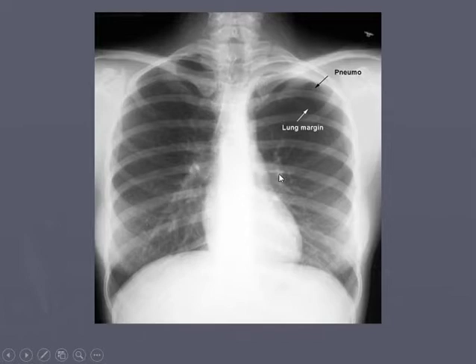Pulmonary artery here, pulmonary artery there. It's flat. Okay? Something's squishing and pushing the lungs. That should be clue number 1, that there's something wrong. Next one, diaphragm. Got a good hump there, got a good hump there. It's wide, but nothing horrible. And we see a good costophrenic angle there.